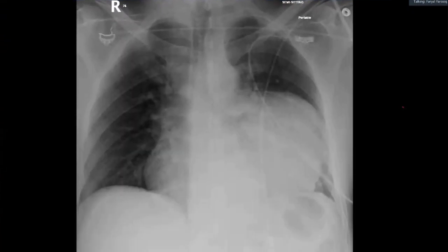I'm provided with a chest X-ray, frontal projection, taken in a semi-sitting position. I can see a homogeneous opacification involving the left middle and lower zones, which is partially obscuring the left heart border. However, the left hemidiaphragm is intact. The costophrenic angles are intact. The left upper zone and the right lung appear unremarkable.